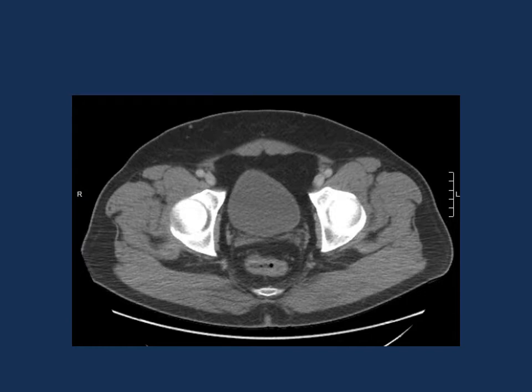Not too much contrast, IV contrast in this one. This almost seems like a non-con again. Yeah, with the fluid fill. Yeah. Fat, rectum, which is tissue. Maybe there is a little bit of contrast there, but it is soft. It's muscular tissue, though, so it's more dense, so more brighter. And then mesorectum, which is fat, which is the least dense, and so it's black.